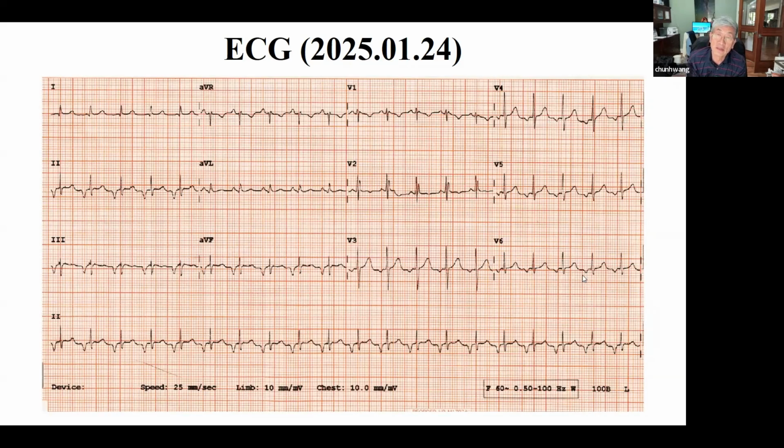So is it fair to say that, looking at your 12-lead ECG, with leads 2, 3 and aVF negative and then left lateral leads negative, it is the left side, posterolateral? Okay? So everybody agrees this is an ectopic atrial tachycardia?